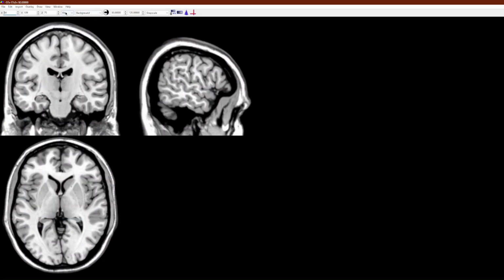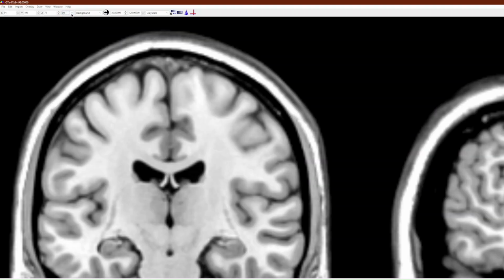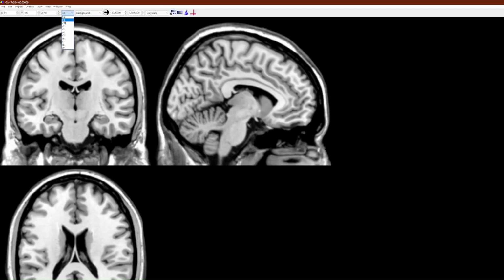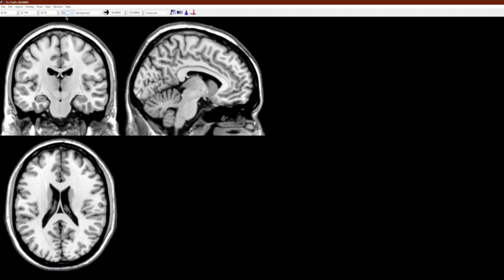And there's also a zoom in option. Let's say you want to zoom in a little bit to see more detail. You can zoom in up to 9 times. There's also zoom in 4 times, 3 times, fit. I usually just do fit. X1 is 100%, X2 is 200%, X3 is 300%. So higher zoom is usually useful for looking at specific details.